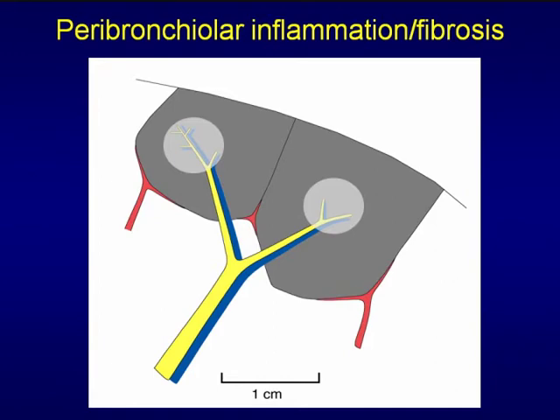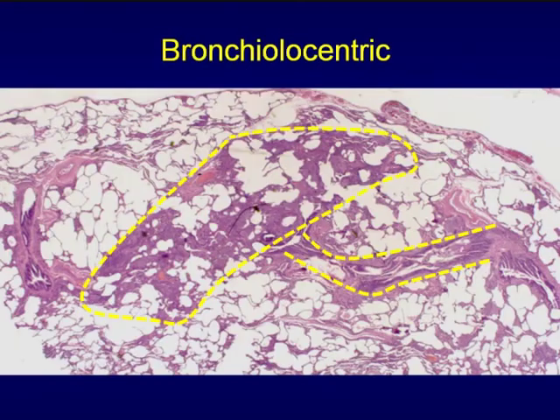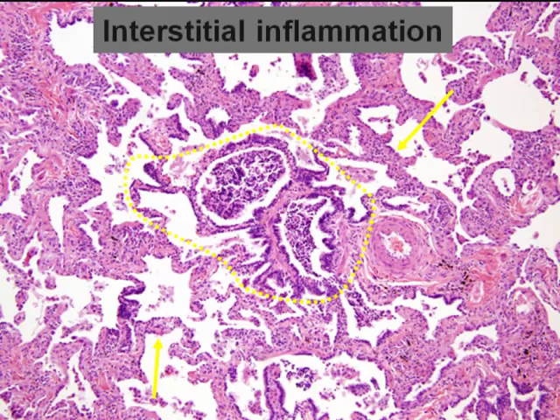Okay, so we're talking about nodules involving the central portion of the lobule, which look ill-defined, and again, you can see the nice distribution, how it's going to be about 5 millimeters from the subpleural surfaces. The pathology, you can see there's the airway running at the center of the lobule, and we can see this interstitial inflammation in this patient with hypersensitivity pneumonitis, and notice how it kind of peters out here at the subpleural surfaces. So this is the pathologic correlate of this radiographic appearance.